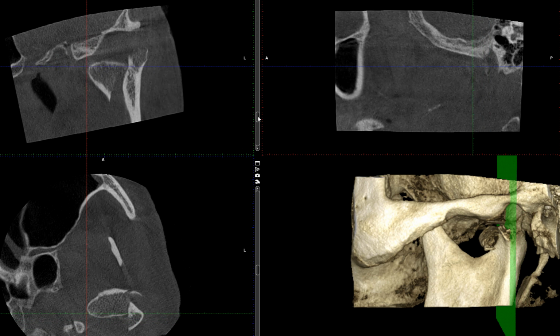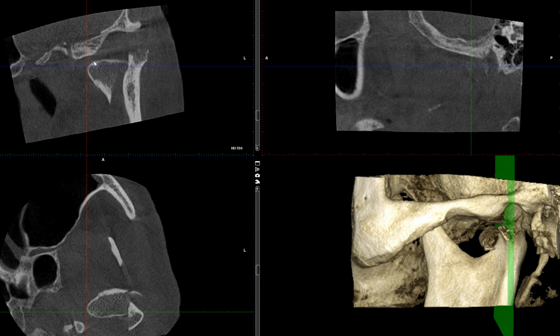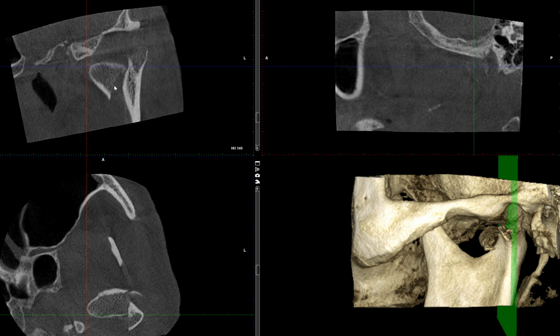So I believe this is a fairly definitive diagnosis, even if you haven't seen cone beam CT before. That condyle should be located right here on top of this condylar neck portion. You see that? This is where it broke off.